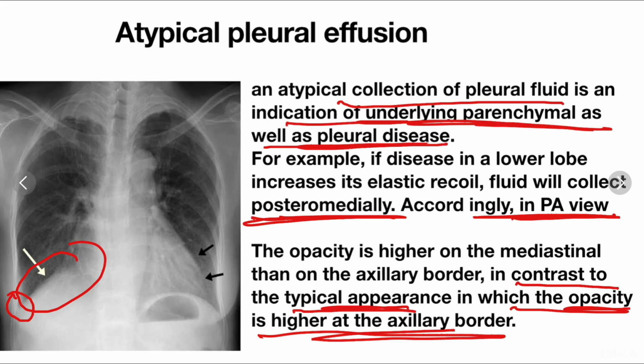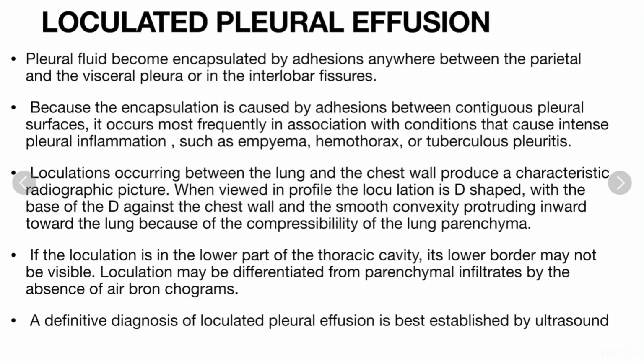So it is also denoting disease. There is a disease in the lower lobe. Because of that, there is an increase in its elastic recoil and it is not compressing the left lower lobe. Oh, sorry, the right lower lobe.